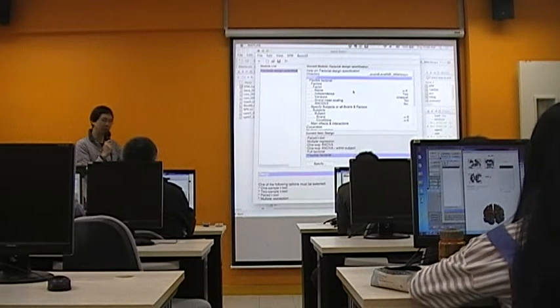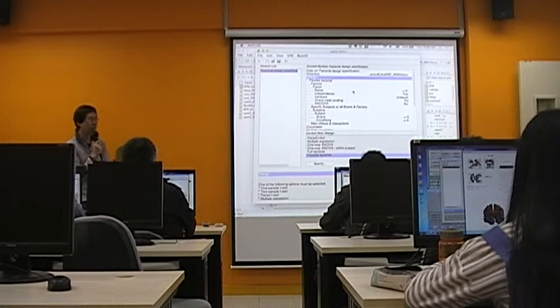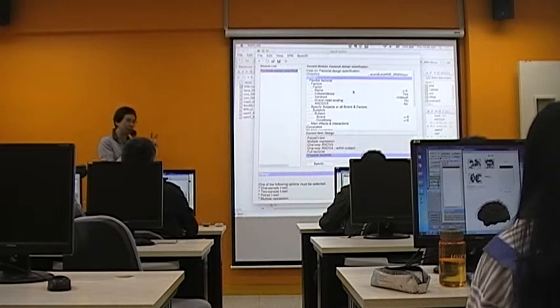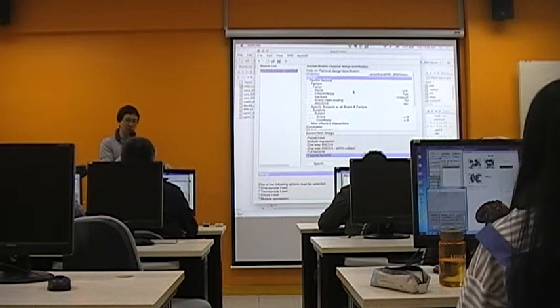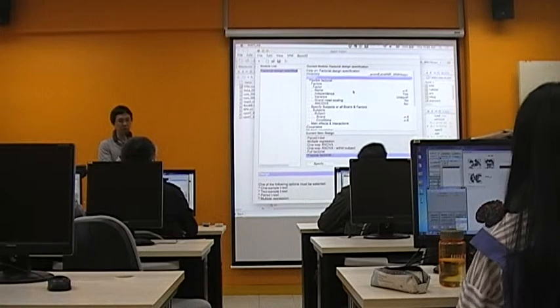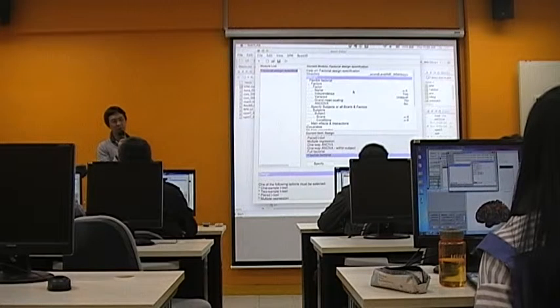Okay? So we are going to contrast one back versus two back again. It's the same. And so there are two beta images per subject: one corresponding to the one back condition, the other corresponding to the two back condition. And then we bring it to the flexible factorial design.